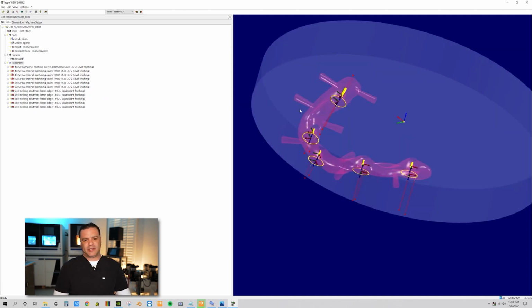The reason I did this is so that instead of remilling the bar from scratch, which took this bar a little over 3 hours, by editing the program and shortening it with a 1.5 and then 1 millimeter, this is only going to take 15-20 minutes. So you're shaving over 3 hours of milling time.